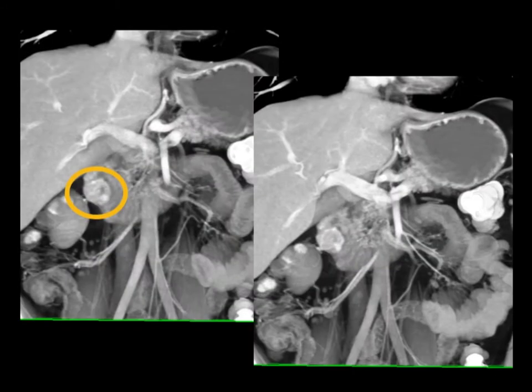And in fact, it looks brighter on the venous phase, which is good for carcinoid tumors. Adeno-CAs are not going to be that bright. Metastasis from renal cell could be bright. And the other possibility would be a GIST tumor, but just a very classic appearance. There's no desmoplastic reaction of a carcinoid tumor.